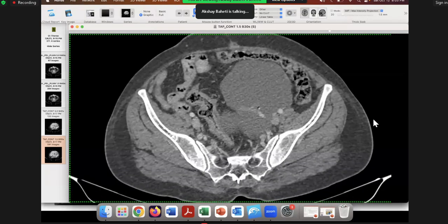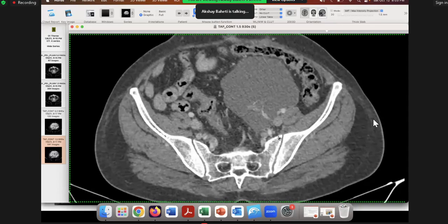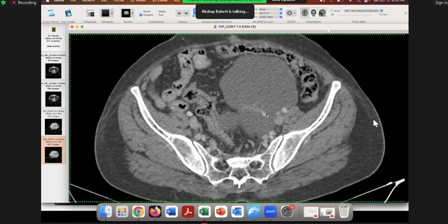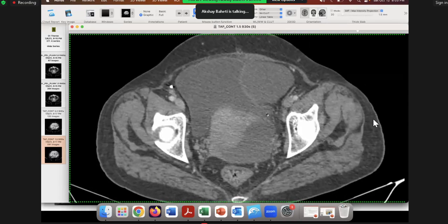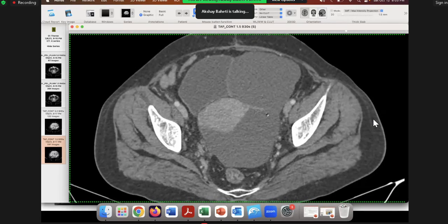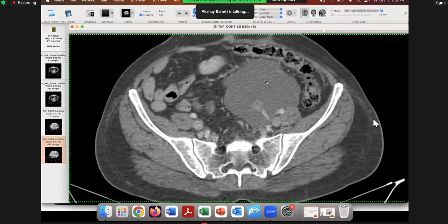And the second is you have to see the ovary, right? This is the ovary. You have to see the ovary generally around the periphery of the mass. Okay. So this is the ovary here. You can see it's in the periphery of the lesion. So the ovary will classically be in the periphery of the lesion and it will continue to secrete. And that is why you will always see this sort of increasing collection. Okay. So both these things have to be there. And if you don't see the ovary on CT, do an ultrasound, you will almost always see the ovary. Okay. But this is always a very classic thing.